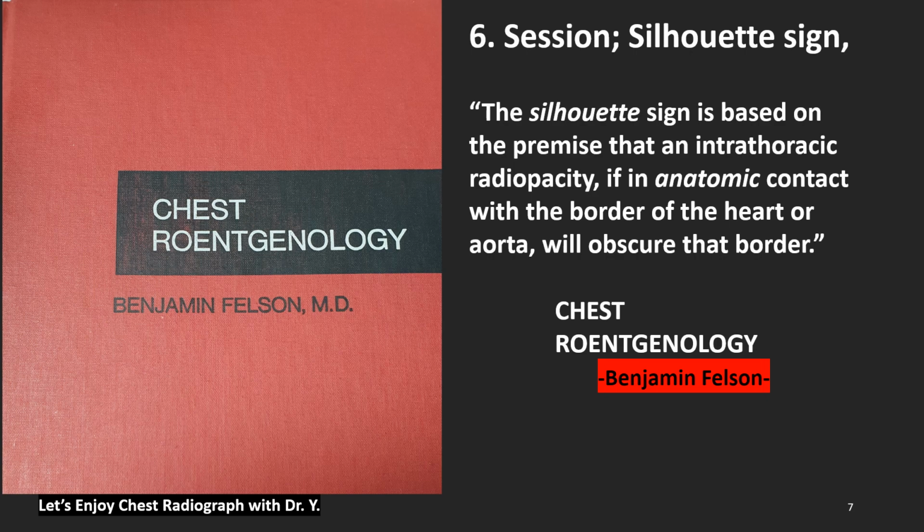Dr. Felson described the silhouette sign in his book like this: the silhouette sign is based on the premise that an intrathoracic radiopacity, if in anatomic contact with the border of the heart or aorta, will obscure that border.